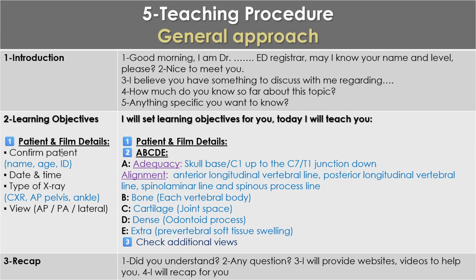It means confirm patient name, age, ID on the X-ray, then date and the time, then type of X-ray, if this is cervical or chest X-ray or pelvis or ankle or whatever. So our task today is cervical, lateral cervical X-ray. And check the view. Is it AP or PA or lateral? Clear now?